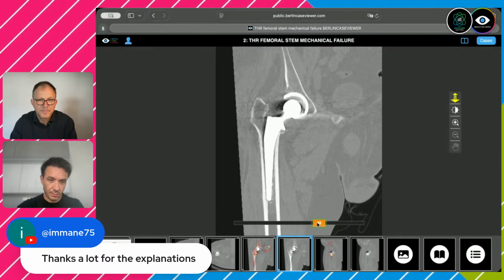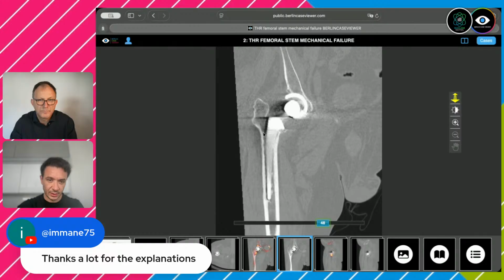If I go here into these slices, this is definitely a metal artifact. But I can see the cortex over here.